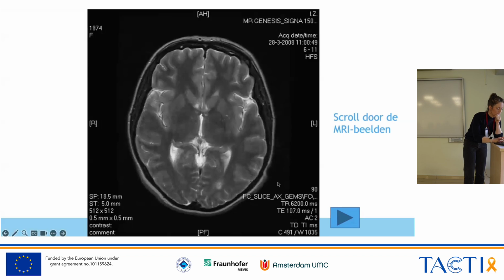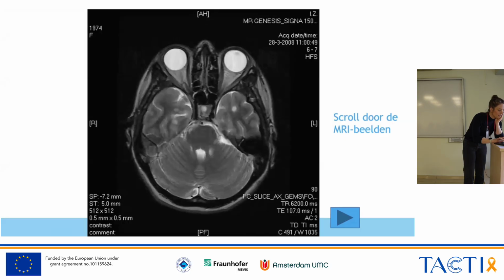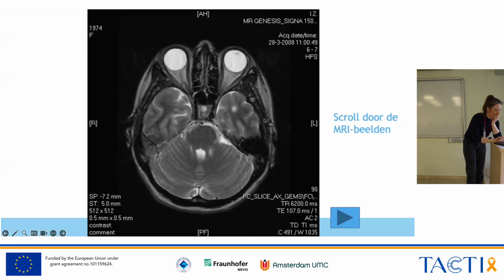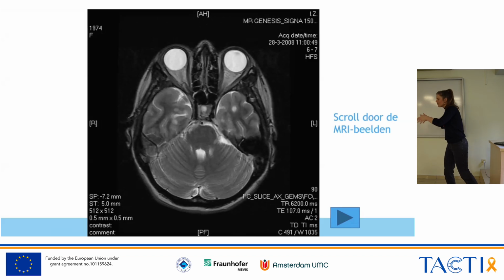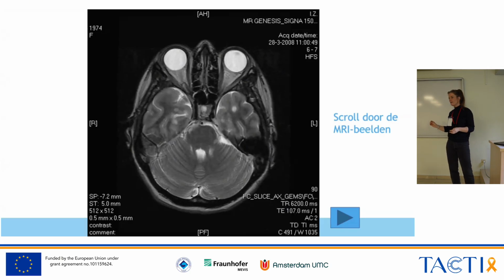And there were some. Yeah, you spotted that well. So here, these are all periventricular lesions. Now if we go down even more, never forget, which lobe? Temporal lobe. Temporal lobe, yes, easy to overlook here and here. Bear in mind that's not one of the 5 locations, but if you see stuff there, it's highly indicative. You're easily thinking, oh, now we look at the infratentorial area, and then you overlook the temporal lobe, and there you also sometimes, in my opinion, can find the juxtacortical lesions. Very often, yeah.